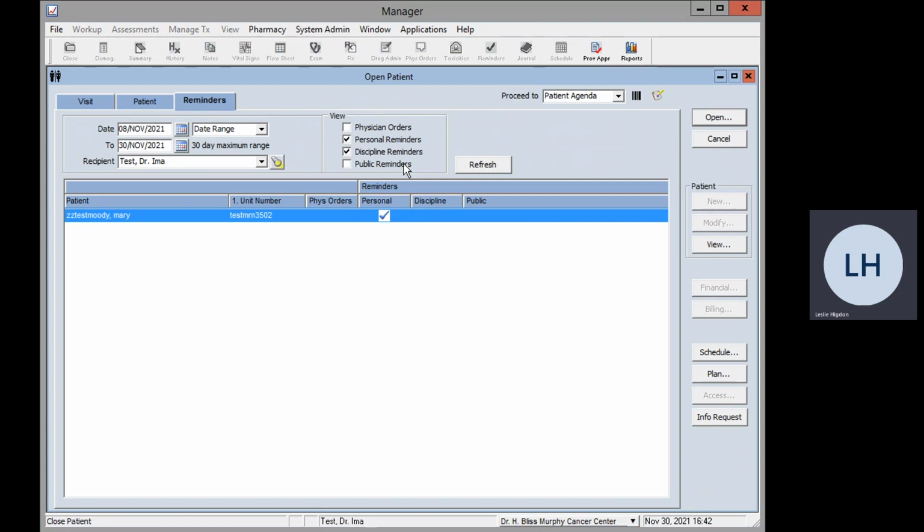For troubleshooting ARIA, if you do have any issues, you can review the help button here with the icon legend and contents and index. And you can also contact your area clinical support team. That information will be provided to you during orientation. There are broadcast messages that can be sent through ARIA. These will appear when you log into ARIA, and it's in very specific instances. So if you see those, it's just to let everyone know something new or an update with ARIA.